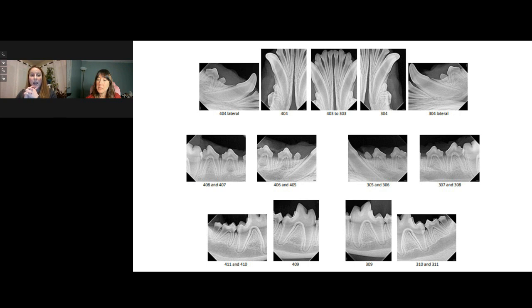So if you're in the mouth early and you identify something early or you see a widening around it, it is definitely worth getting those teeth out. If you are identifying it in a much older patient and there is absolutely no evidence of widening of that region, you're probably going to be more okay.